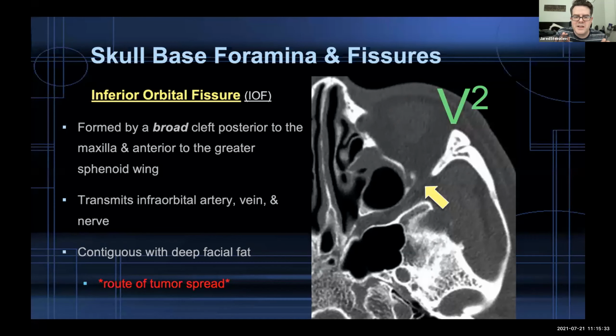So that's where things get really tricky to image, because things are going in, going out. There's a very broad interconnection between the skull base and the face at this junction. So cranial nerve 5 is, again, very complicated, but it's a route of tumor spread. And that's what I wanted to show, for sinonasal cancers, to get to the skull base, to get to the point where they're just inoperable. And we have to find where the disease is, so they can treat it.